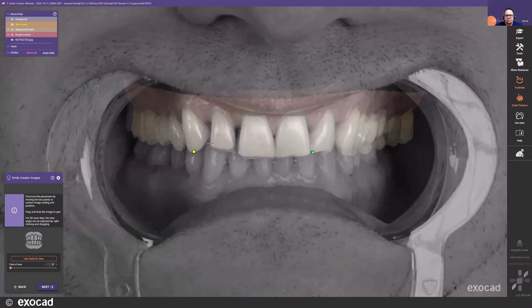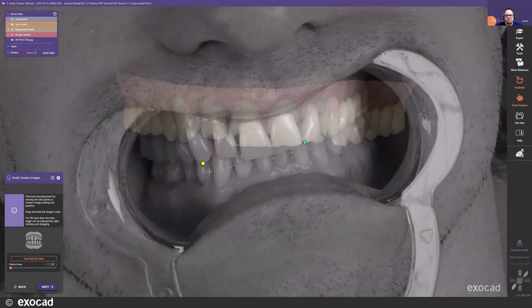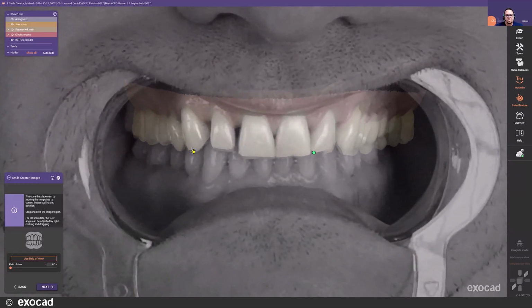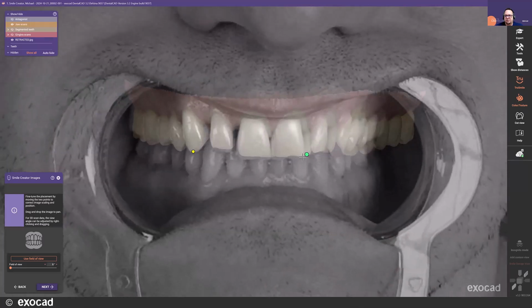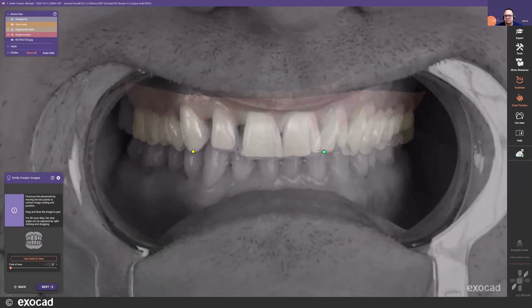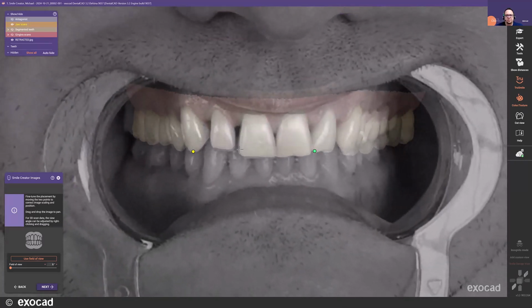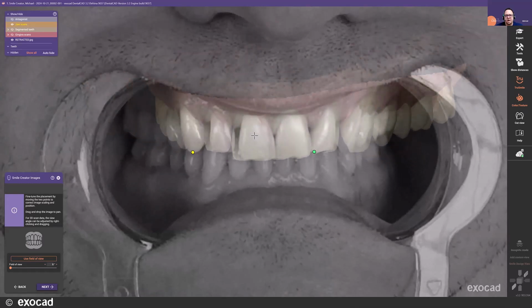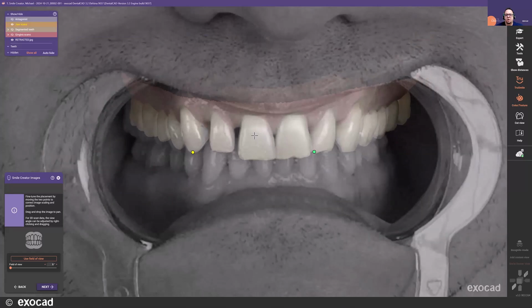With alignment of photos, you'll see your control points to adjust any of the automatic alignments. When you're adjusting these, essentially it's scaling and rotating the image all at the same time. So alignment is very intuitive and it can be done rather quickly. From there, you can also rotate your model in the background, which will create a scaling factor as well.